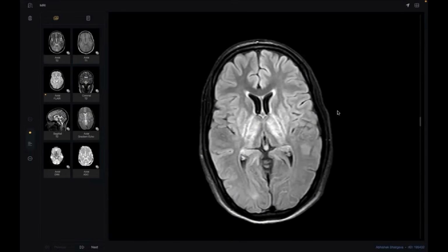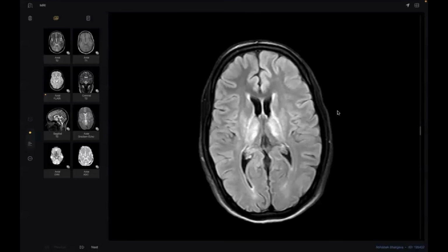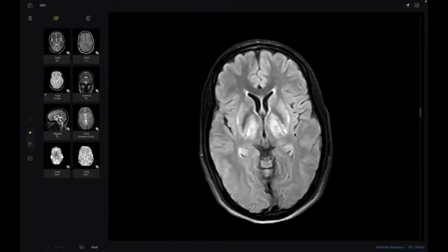Is it uremia? Is it encephalopathy? So I will search for any characteristic sign. Number one, go to the midbrain. If you find this panda sign like this, you smash the case. This is Wilson disease. If you didn't find it, search for another, the distribution at least.